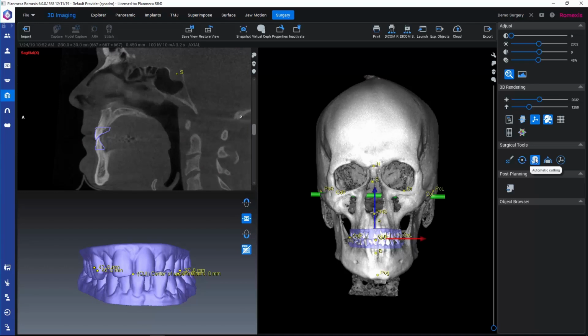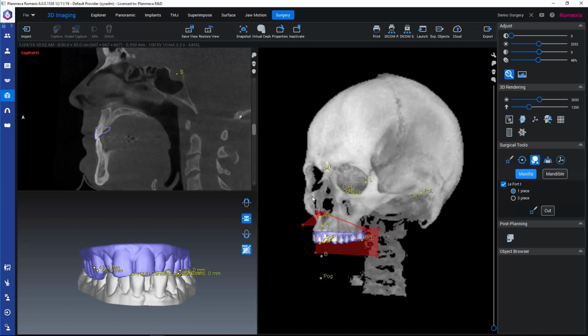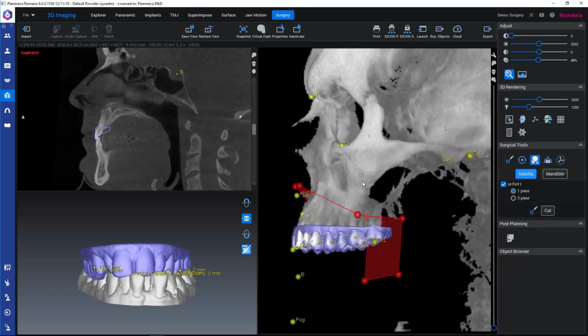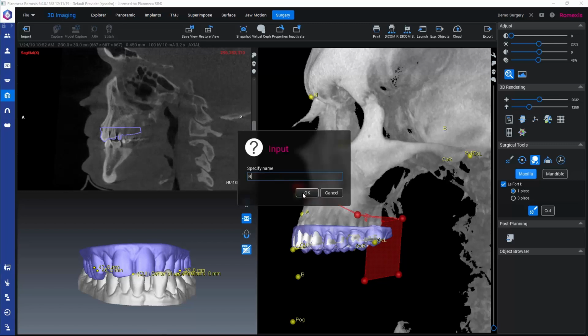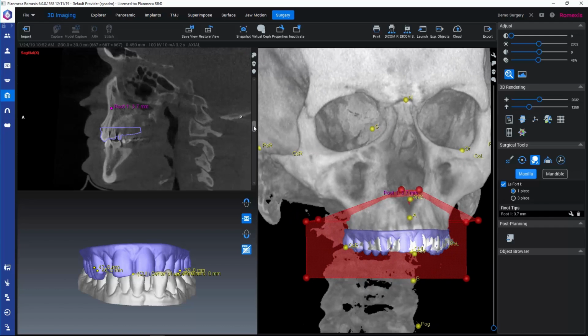So then we can move on to selecting the osteotomies for cutting the bone. So now we had already selected this Lefort one piece. So like we see, there's also other option, and maybe later on some further options as well. Okay, and now before we adjust the planes for the maxilla, the cutting planes, let's add a root point. So we activated this root point marking tool in the toolbar, and we're selecting that point with Alt down and with our left mouse button.